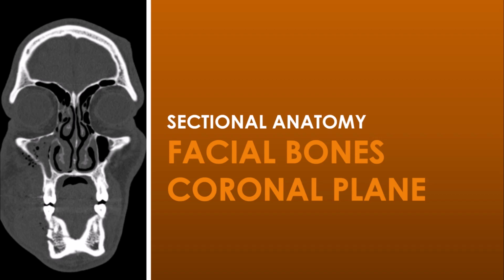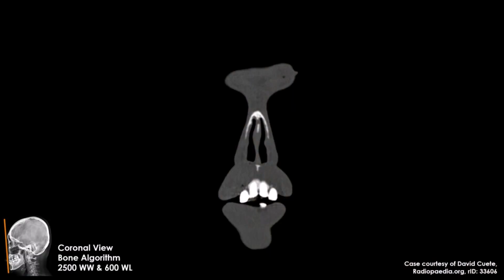Hey everybody, welcome back. This lesson is about the facial bones as seen in CT imaging. We'll look at the facial bones using the coronal plane. This is a coronal reformation of the facial bones.